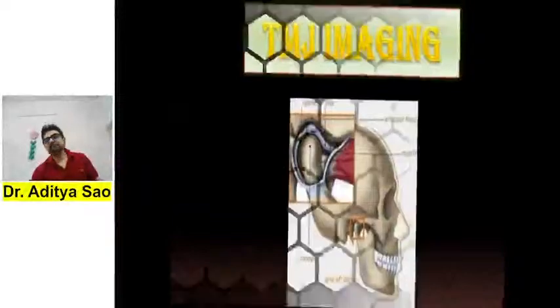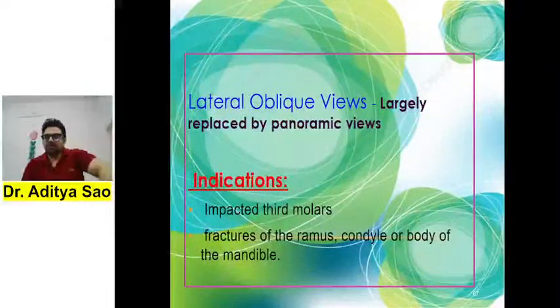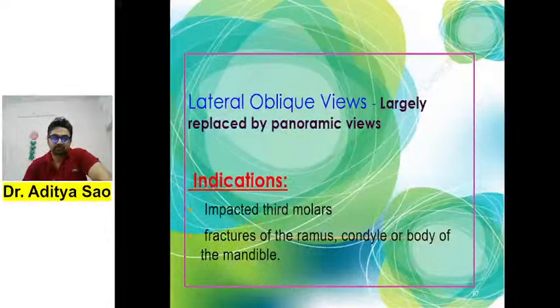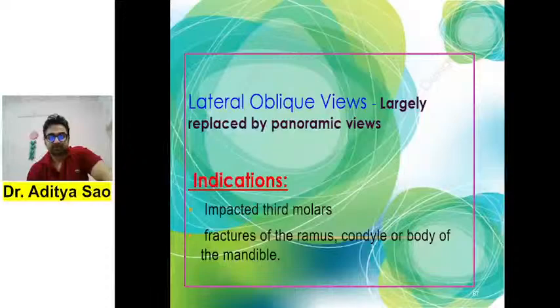Just tell me, if there is a question on horizontally favorable and unfavorable fractures, which is the best view? OPG is the best view. Okay, not lateral oblique.